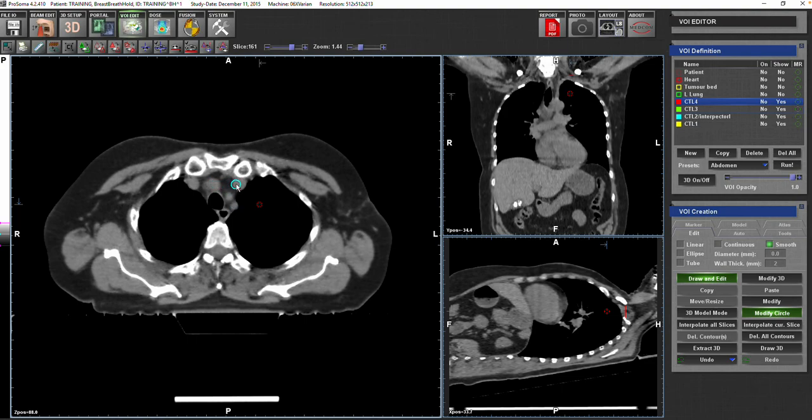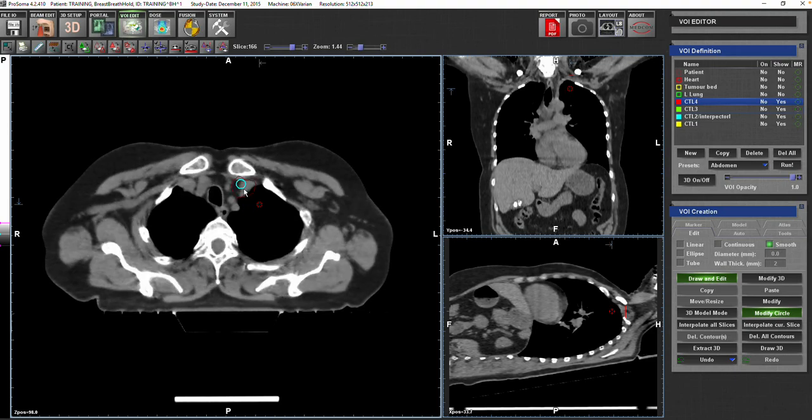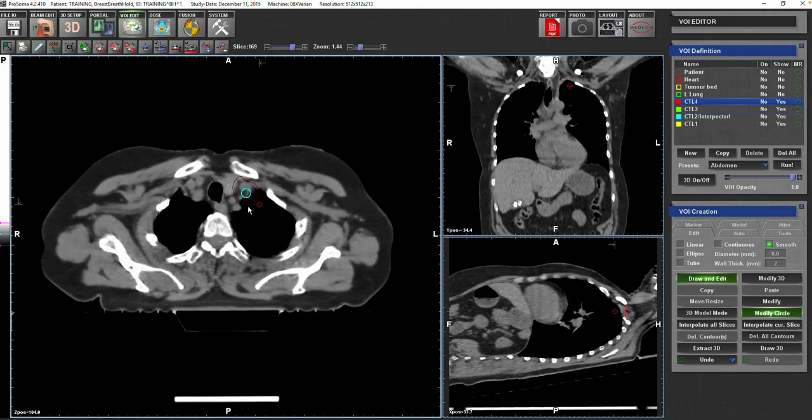So this should be the start of the innominate vein. If you do it like that, you just cover the vein, and there will be a dot just beside the vein, and clearly this is the internal mammary artery, as we mentioned in the previous lecture. Now we are familiar with that. This should honestly be the start of the internal mammary chain, but I will leave it there, and I will go one or two cuts up, and I will see how the interpolation will look.